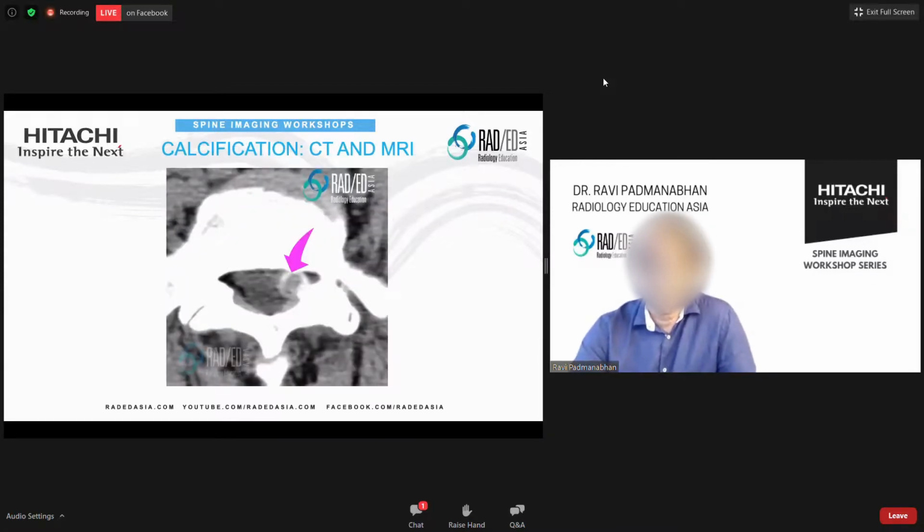And if you see the sort of rounded calcification around the region of the facet joint, again within the spinal canal, this is also a calcified facet cyst.